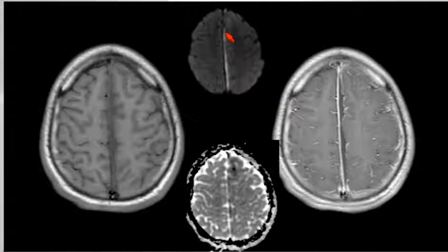Why does diffusion show bright signal and true restriction when you work through the ADC? It actually correlates very strongly with the white blood cell count of the pus. So it's interesting that the cellularity of a pus pocket leads to this diffusion restriction.